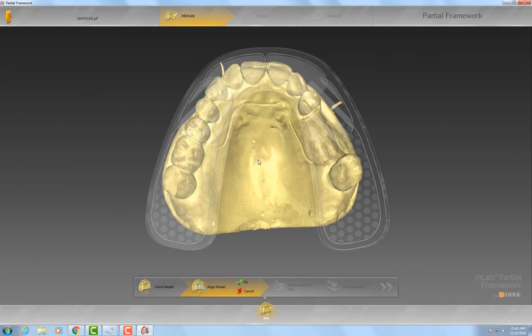And because it's doing this one, we have a new way: you print this. It's already blocked out. You go ahead and dupe the frame with the model, and then you remove the model, and then you have the framework inside, or the print, or whatever it is, and then you just pour stone back into there, and you now have a blocked out model. It's reverse engineering it.